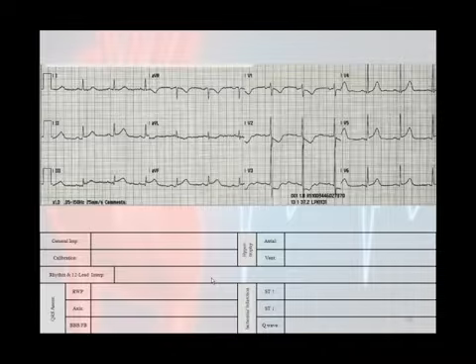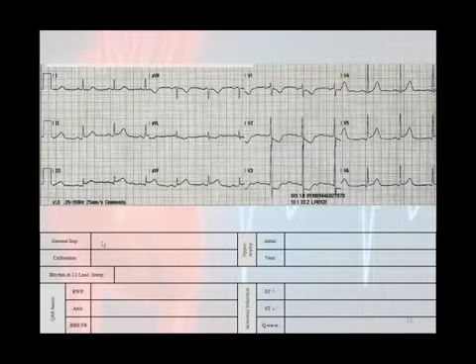As we look at this one, do you see any ugly morphologies? Did you see any excessively fast or excessively slow rhythms? When we look at the EKG here, it does actually look like that we have some ugly morphologies. If you look over here, that doesn't look right. This doesn't really look right. You actually can see some elevation here and here. That definitely doesn't look right. So there's some ugly morphologies there.